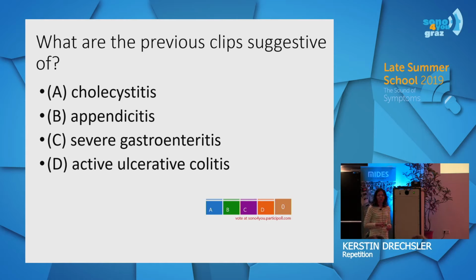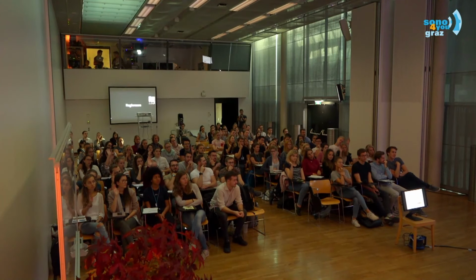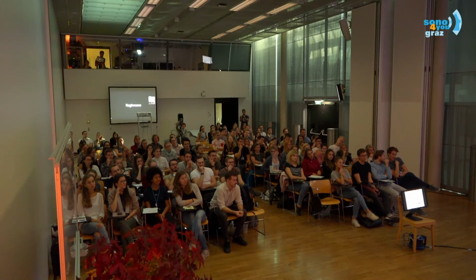So which pathology is it? Is it a cholecystitis, an appendicitis, a gastroenteritis, or is it an active ulcerative colitis? Who is for A? B? C? And D? I think most people took B, but it's actually not.